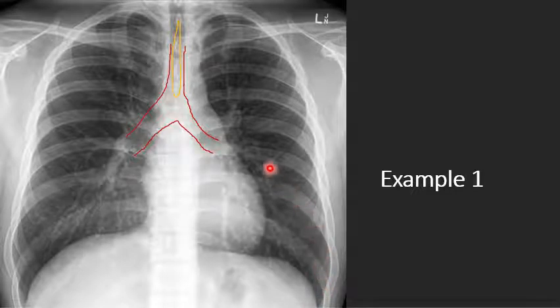That being said, when we go over here to our hilum, everything looks pretty equal. Have a little bit of maybe some congestion here, maybe not, who knows. Contextually, that's where you go and evaluate the patient. Then you look at your heart, it's less than 2/3. It looks like it's aiming to the left, which is great. Here's the right ventricle, a little bit of the left ventricle, right atrium right here. And remember, your left atrium is posterior, so you don't see that one.